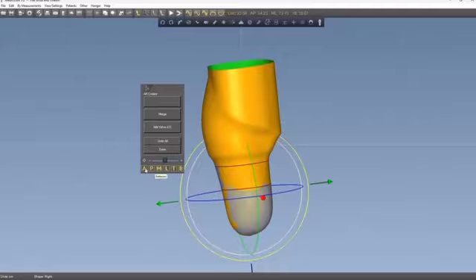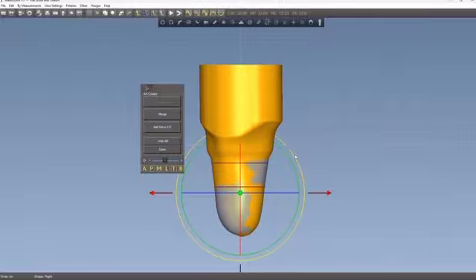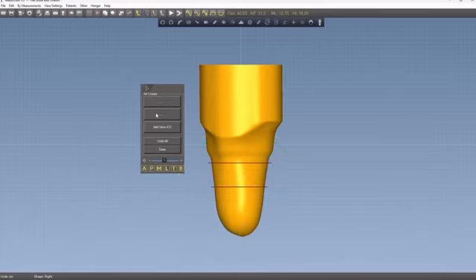I'm clicking on anterior, and we can then do some alignment if we wanted to. And once we've got everything in the correct position, we just click merge, and you'll see it will create and resize the brim so that it'll all be done effectively.